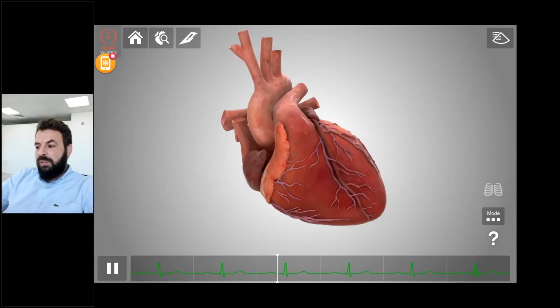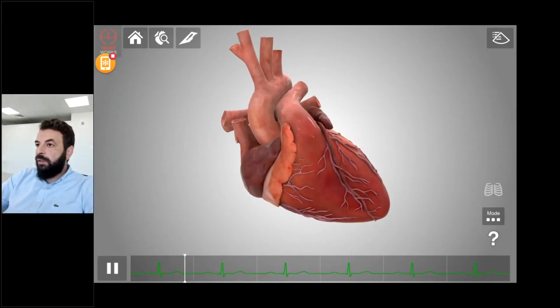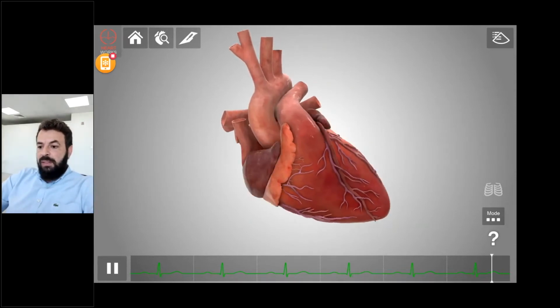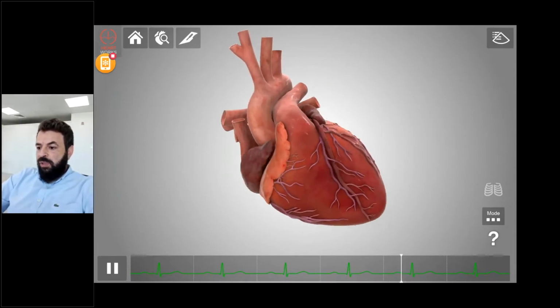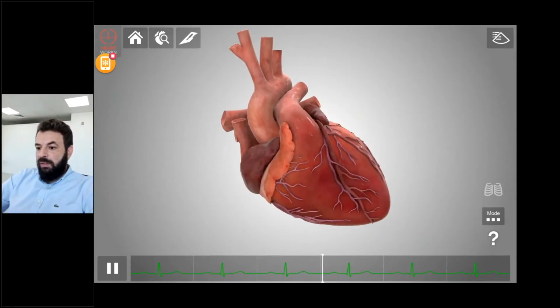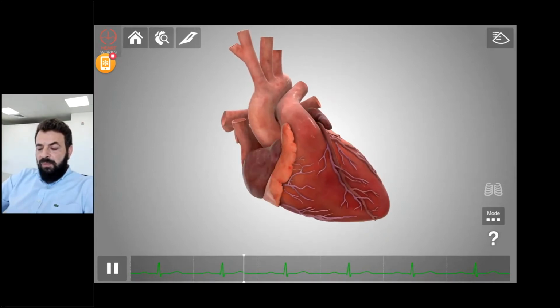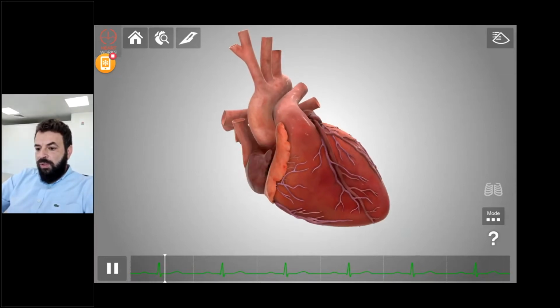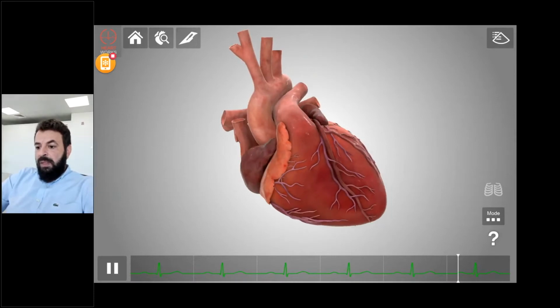The teacher can project the screen on any TV or a projector, or even wirelessly, for class teaching. For remote teaching, by simply downloading TeamViewer or any other software on this tablet, we can grant access to all students to this software where they can practice their self-teaching.